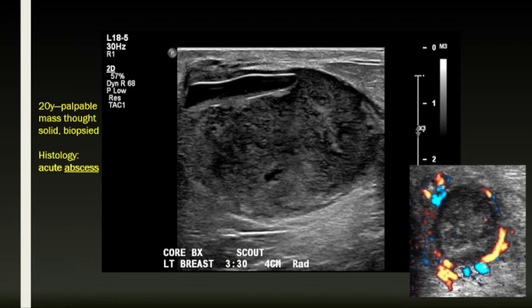And what you can see here is this we published in BIRADS with its very pretty, it came from Italy, submitted by Giorgio Rosato, who is an Italian radiologist who subspecialized in breast ultrasonology. And here you find this beautiful rim abscess. But is the content solid? Is it liquid? It had thick material that was difficult to aspirate and sometimes incompletely aspirated, but possible.